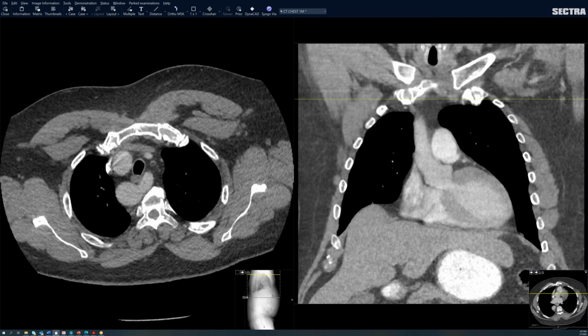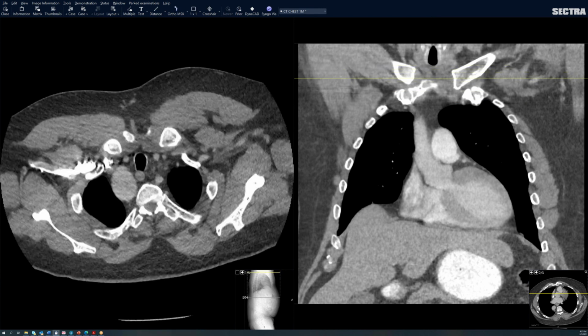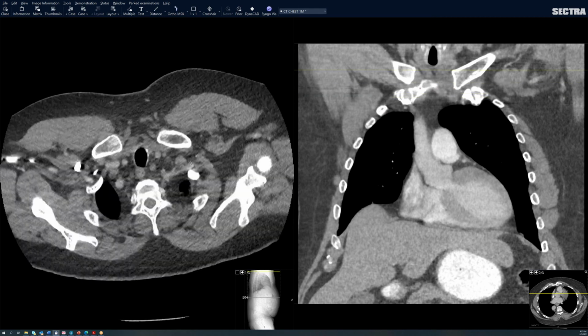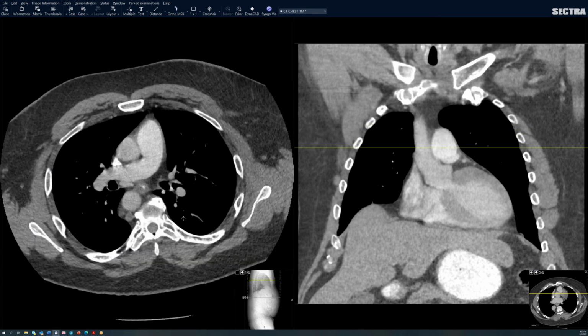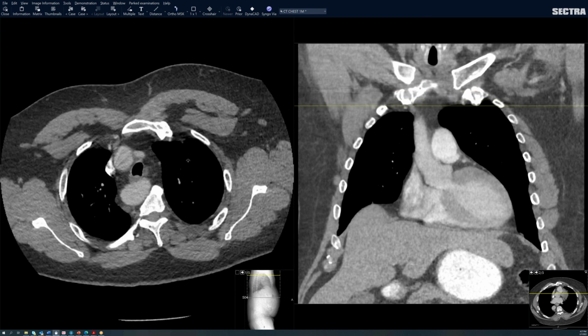So regarding the aortic knob, you can see it's a right aortic arch. You have an aberrant left subclavian artery, and you have a diverticulum, which would indicate a left-sided ductus. So this is a complete vascular ring. Now, just curious what everybody thinks about the pulmonary arteries and their anatomy, and then I'll show you the lungs, which I thought were the other interesting part of this case.